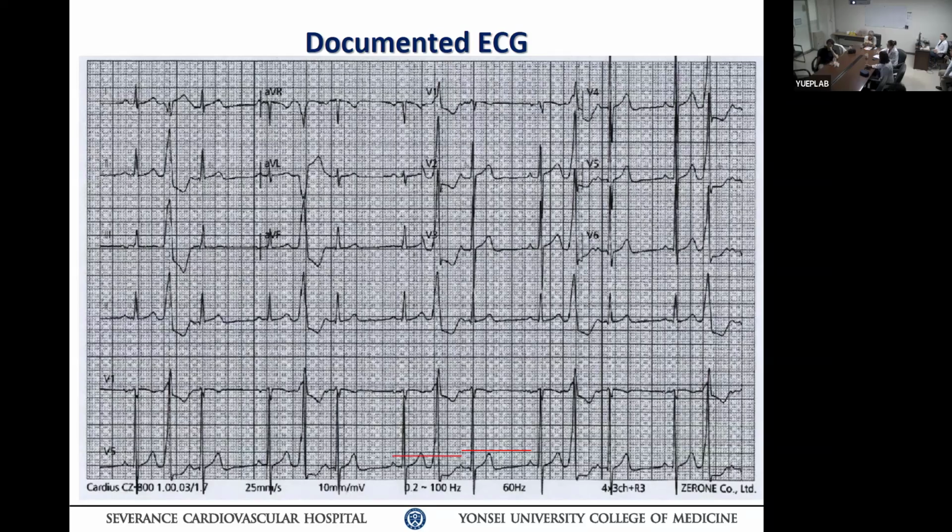But your coronary sinus catheter will be the reference. So you've got to have a coronary sinus catheter. Great. Okay. Because if this PVC has a preferential conduction pattern, it can even be aortomitral contiguity. The ECG only shows where the PVC exits, it doesn't show where the source is. So you need to define that as well. But this is a very important structure here, very complex.